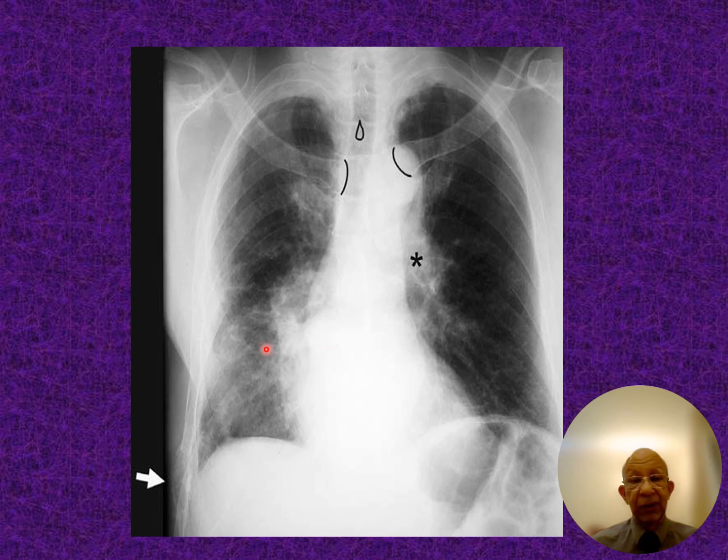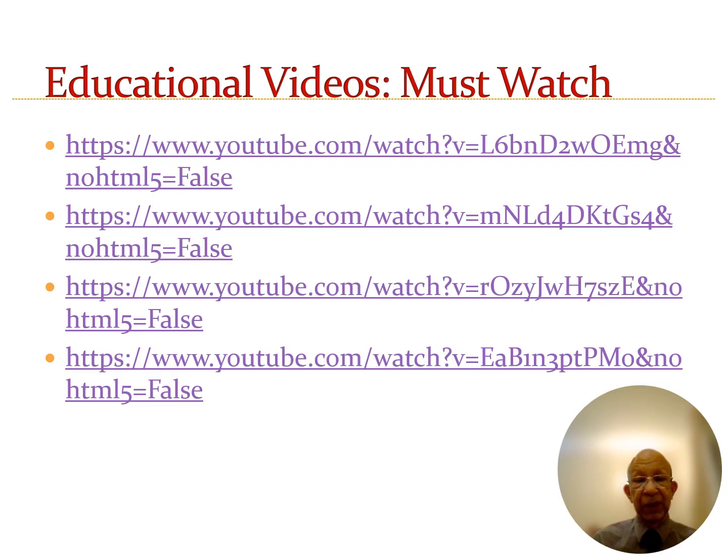This is an X-ray. You can see there are abnormalities in this area on the right side, right? But the interesting finding is that the ribs here, if you don't look at the bones, you might miss it, right? So the ribs are eaten. So this is suggestive of a pathology there. It's actually a metastasis, a rib metastasis, right?